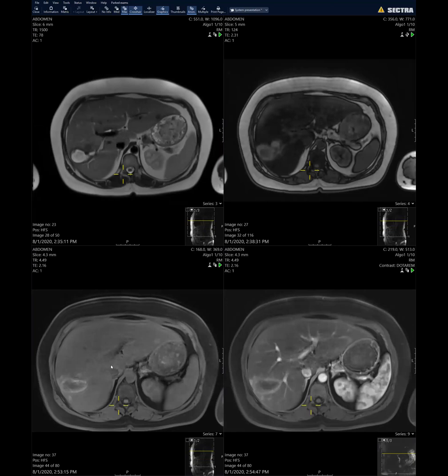But in this one, we have recommended a follow-up with EOVist sometime later, maybe in 6 months, and see if all of these lesions show washout or some show, I mean, there could still be areas of fat sparing in this, no doubt. But given that one lesion probably degenerated or bled, the hypothesis would be that these are probably multiple adenomas. Yeah, this is another kind of diagnostic conundrum.